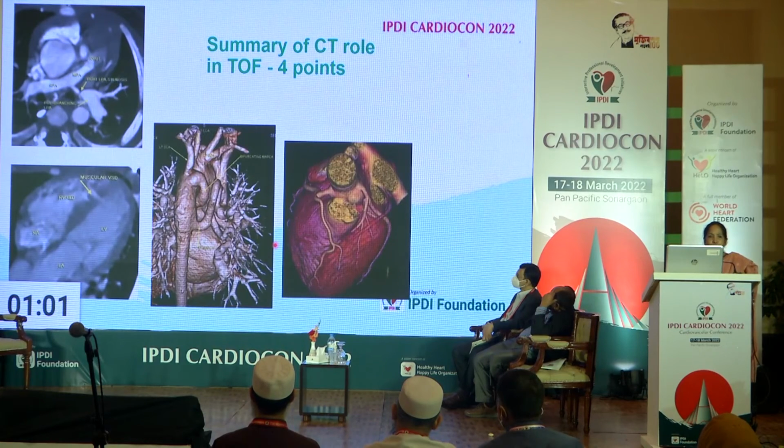Here is a patient with mild TOF but a right-sided aortic arch. It has little clinical implication, but sometimes it produces difficulty for the surgeon with cannulation during surgery, so it should be mentioned in your report. So you can see how CT can nicely demonstrate all the important 4 points preoperatively to guide the surgeon.